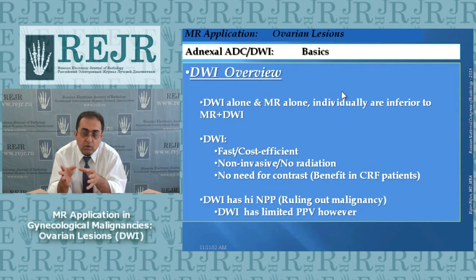The rest of the MR is more anatomical imaging. So MRI enhanced by DWI is actually functional with incorporated anatomical imaging at the same time. Think of this, that DWI MR is like PET CT, just a little bit better maybe.